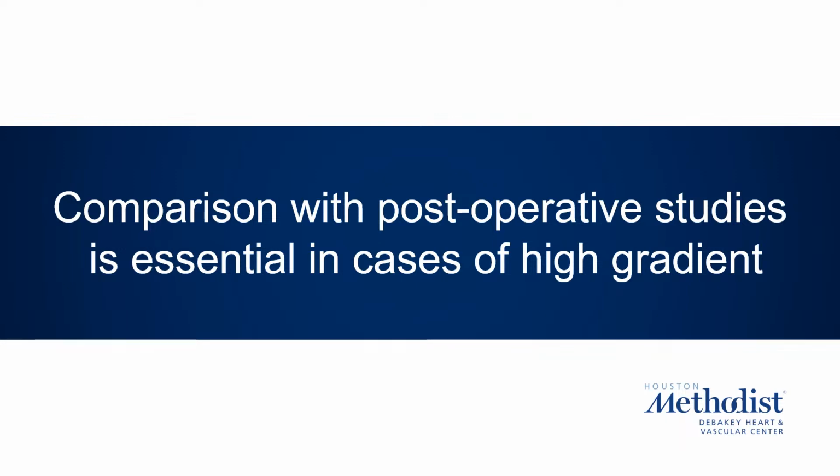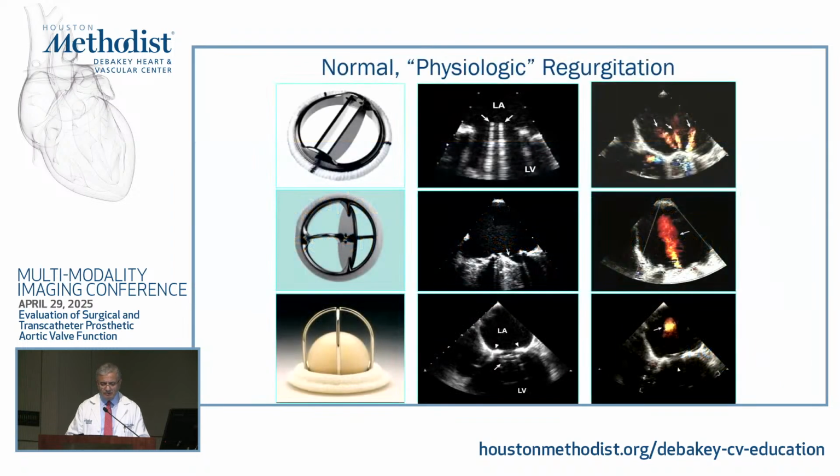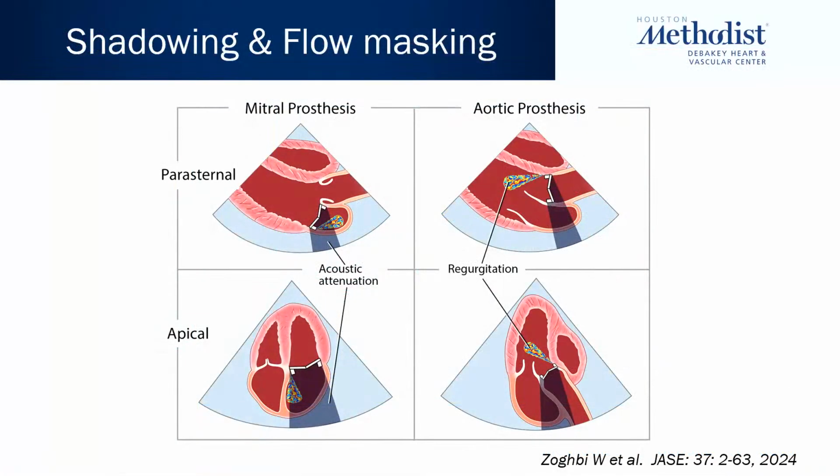So an important message is each post-surgical echocardiogram. Ideally, yes, you do it about 3 months or so, but most often you will do it pre-discharge, because not only are you looking at the valve per se, you want to look at the ventricle and see whether you need to change medications, and see if there is any effusion or other things. But this is very important because this is a fingerprint for each particular patient that you will follow down the line.